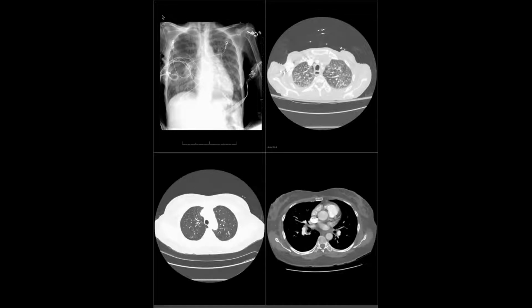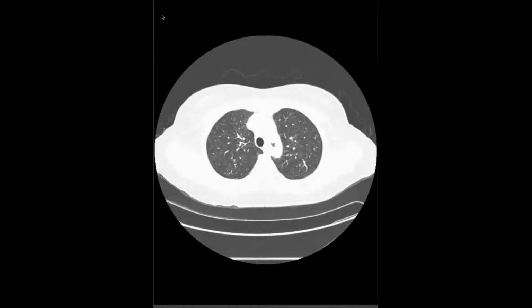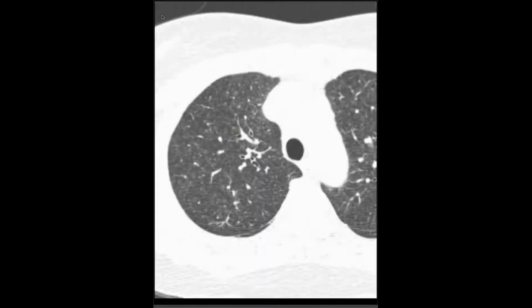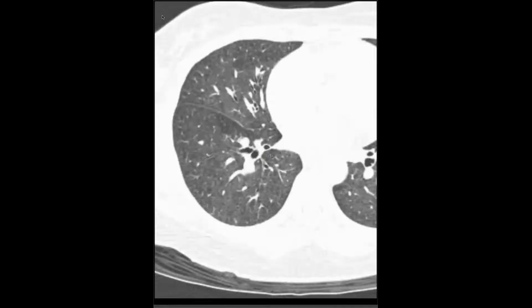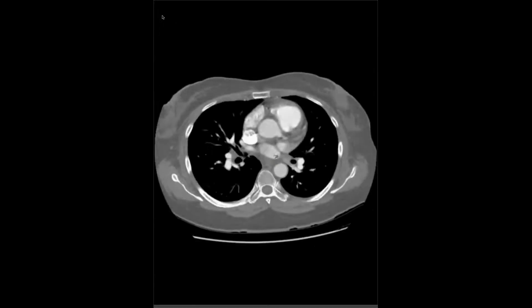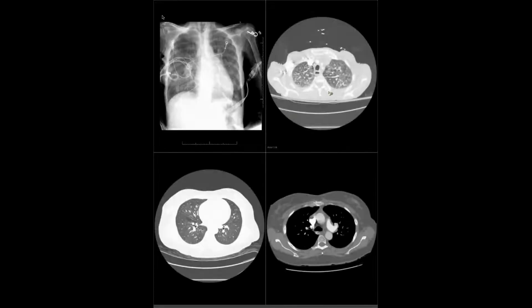Excellent. So this first one is a lady with pulmonary hypertension, which is something I struggle with quite a bit, and they're calling her Group 1 pulmonary hypertension. This is a CT from 2016, and I think there might be some really tiny nodules here in the apices. It's tough to tell. They're thicker slices, and then coming down, there's not so much discrete nodules as maybe a little bit of centrilobular ground glass, but hard to tell. There was also a CTA done at that time showing lack of any significant clot burden.